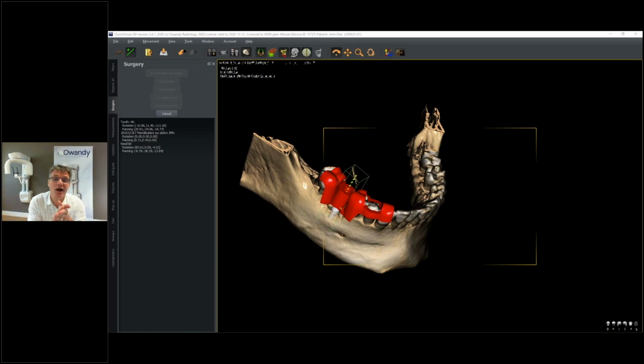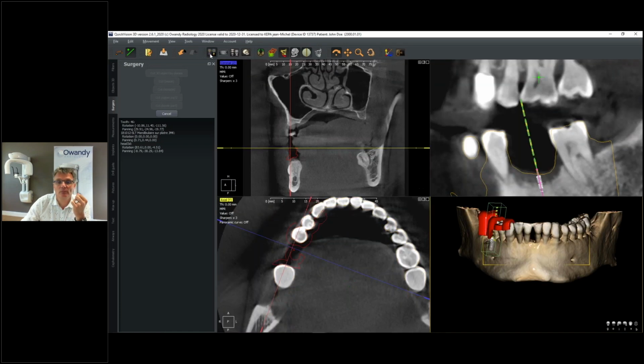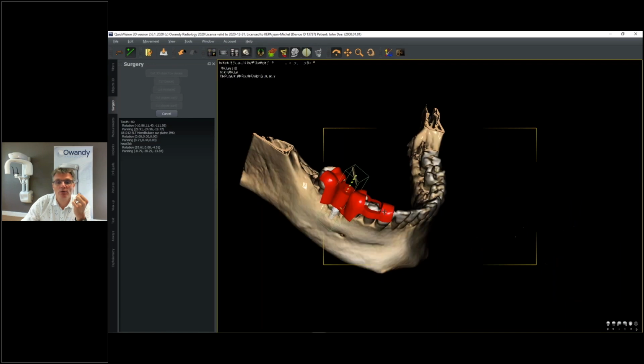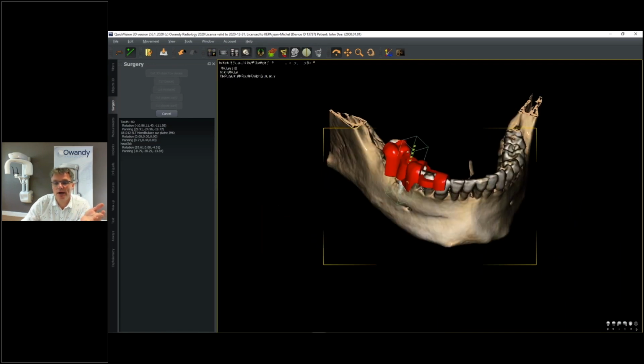While aligning, you saw, remember, the matching area. While we align, we are able then to create, either way, the surgical guide.